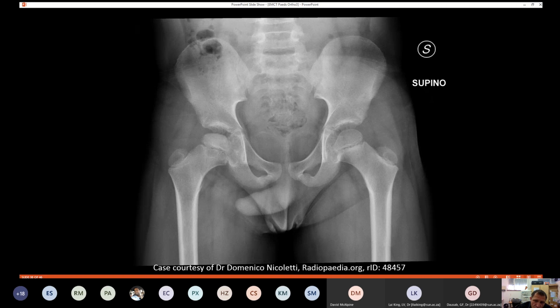Right, this is an example of Perthes disease or Legg-Calvé-Perthes disease. Those are the 3 gentlemen that described this condition. And in this X-ray, you can appreciate that the femur head on the right is more irregular. The joint space is more irregular and probably less than on the left. This is idiopathic osteonecrosis or AVN of the femur head.